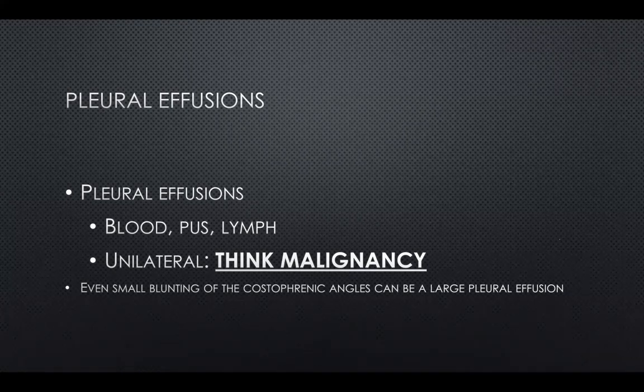We also always try and think of pleural effusions as just the costophrenic angles, but you can get pleural effusions that go all the way up within the fissures and all the way up to the apices. So do make sure you look for pleural effusion.